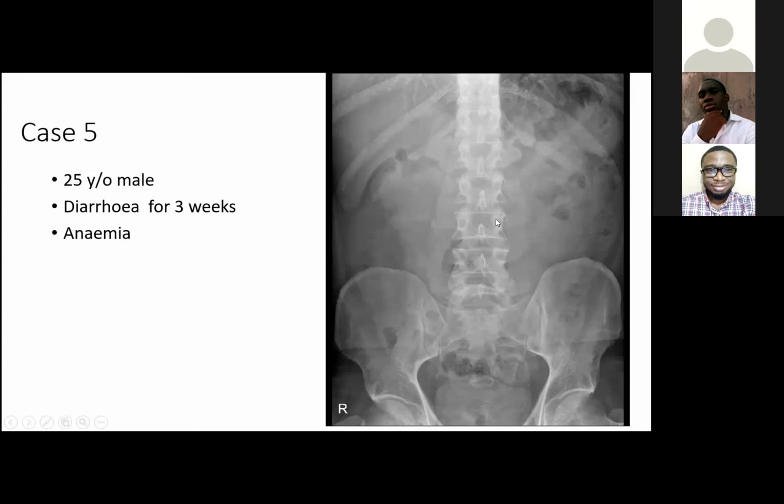This is probably not the most easy X-ray to interpret. I'll just talk you through this one first, and I'll see if you can take it on from the next one. So this one shows edematous transverse colon, my arrow just hovering over right now, with areas of thumbprinting. In a patient with diarrhea, also with an absence of formed fecal residue in the right colon. This again is consistent with a diffuse colitis. Obviously, in a young patient, the 2 commonest causes are going to be infection or inflammatory bowel disease. But certainly that's what the X-ray shows. The rest of the bowel gas pattern is normal.